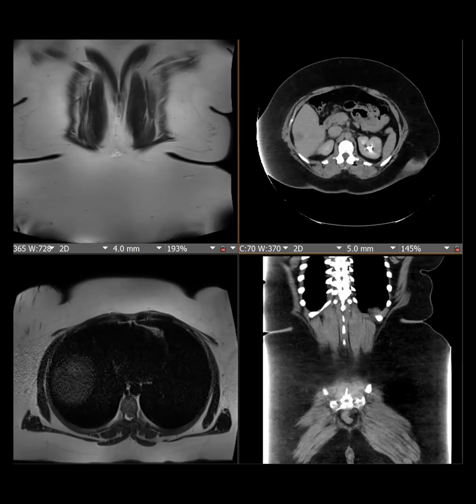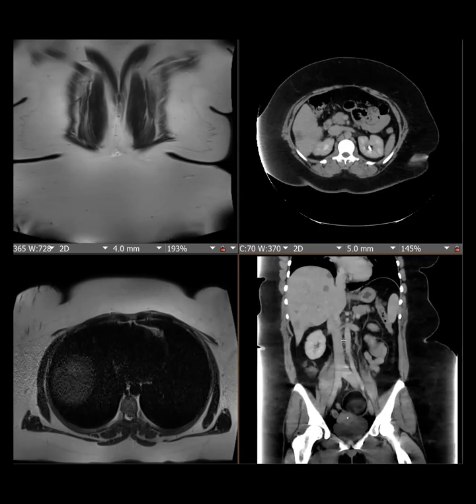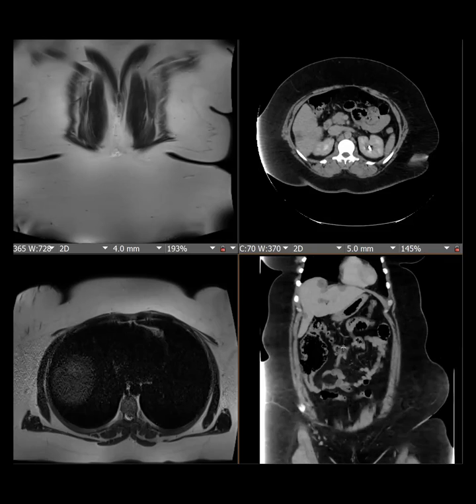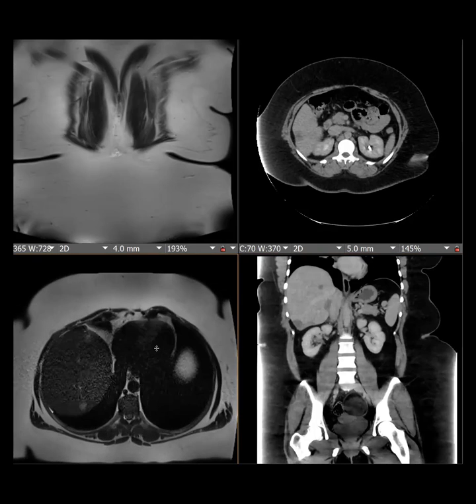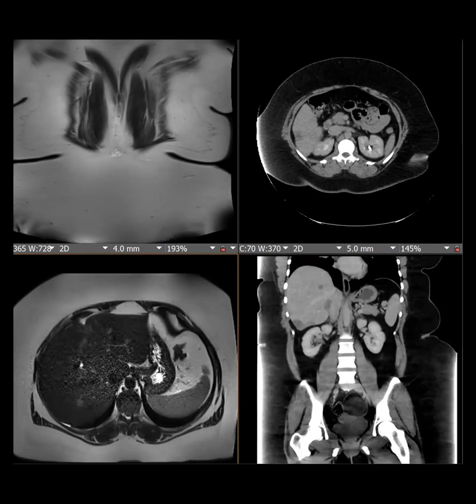Yes, I agree, Dr. Eberhardt, these are not cysts. Between this examination and the patient coming to us for the MRI, they actually performed a biopsy, and this is biopsy proven for the entity that I'm going to show. I wanted to show the T2 sequence on axial and coronal.